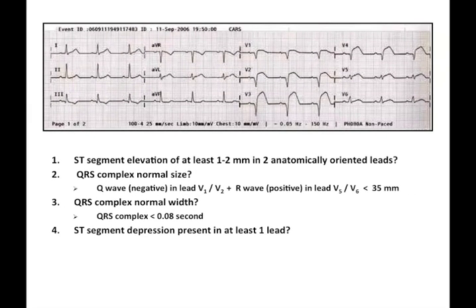Another challenging ECG. Is ST elevation present? Yes, it is. Leads V1, V2, V3, V4, V5, and perhaps even V6 have ST elevation. The answer to question 1 is yes. Okay. Is the QRS complex a normal size? The QRS complex is in fact quite small in V1 plus V6, so we can say that the answer to that question is yes, it is normal size.